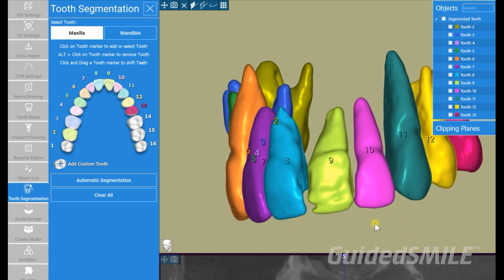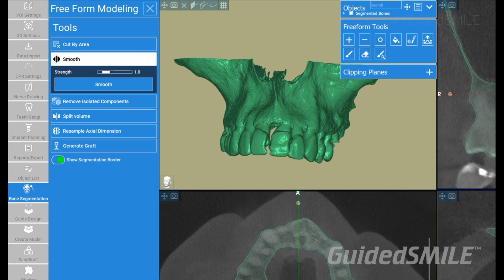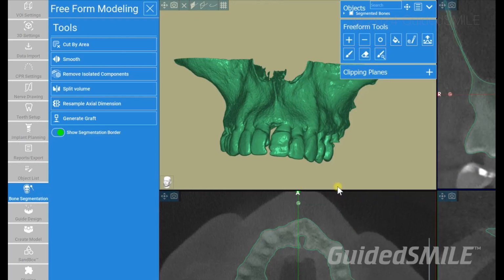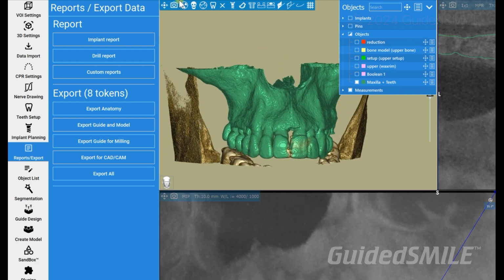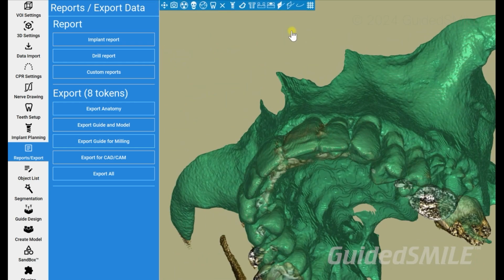You can visually see exactly where the root is in a bright color. So if you're trying to put an implant in it, around it, next to it, through it, or you're trying to put fixation between two roots, or you're going to be in a root, the visualization is perfect for you, the user, and then for whomever is going to complete the surgery. Maybe it's you. The visualization couldn't be any better. We've completed many cases with this because we're a beta company.